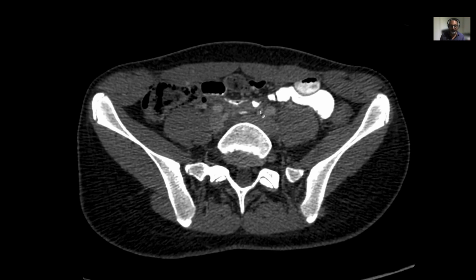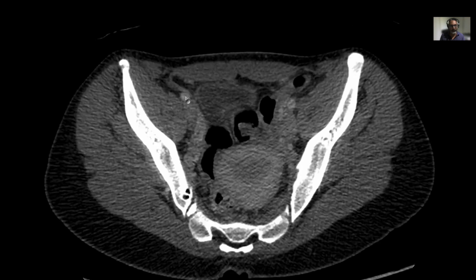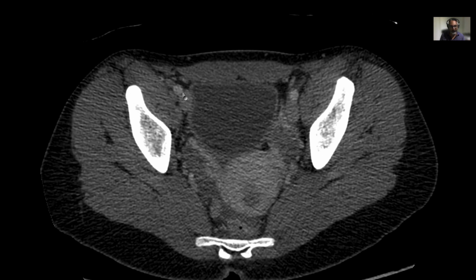So the lymph nodes around these groups are now common iliac. Now, when the common iliac arteries divide into external and internal iliac arteries, then the lymph nodes around the external iliac, let's just follow it all the way until it becomes the femoral artery, which is here, are called the external iliac nodes. And that's the external iliac vein.